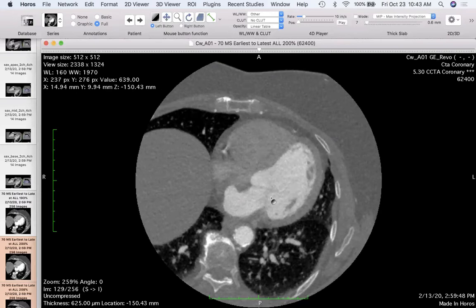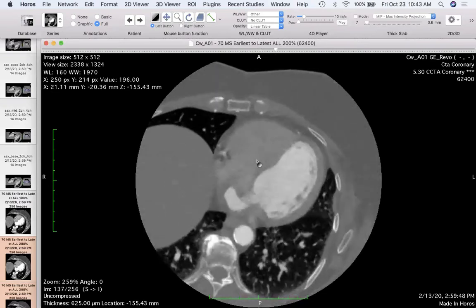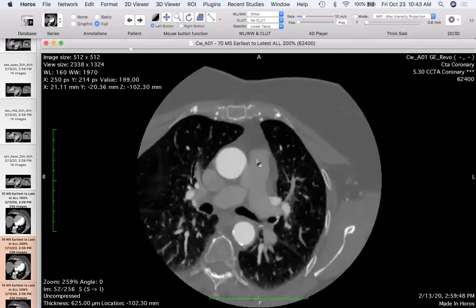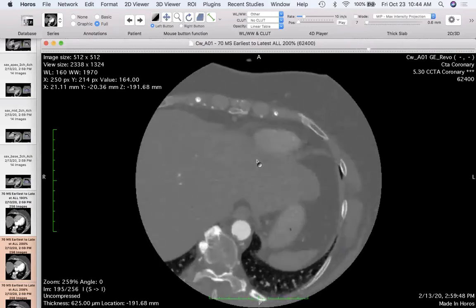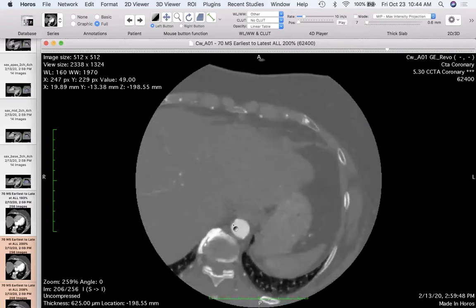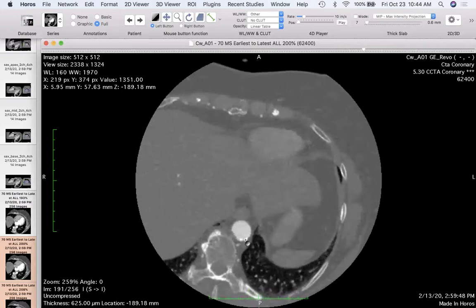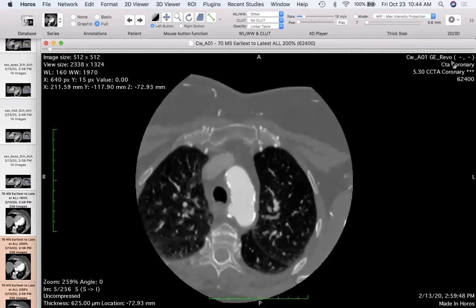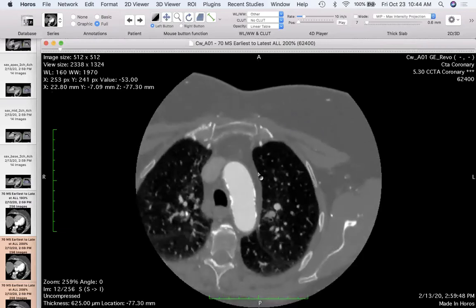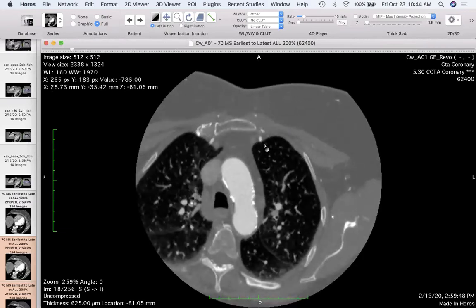So we'll be challenged probably with signal to noise because the x-rays have to get through this person. So again, going with my two-finger method, I can raster up and down and make sure all of the slices look okay. And if you notice, that does look okay. See all the bright stuff coming in the aorta? That's calcium on the wall of the aorta. That's never a good sign, but this person, we don't have their age, but they're probably old enough, obviously, to have a lot of calcium on the wall of their aorta.